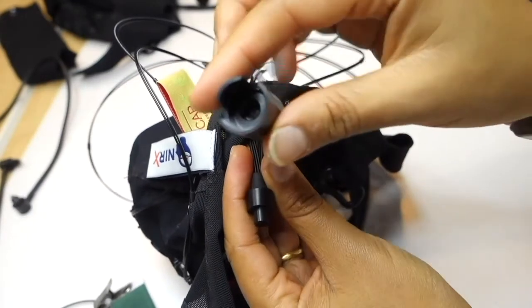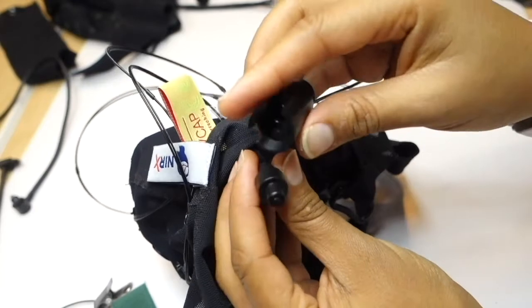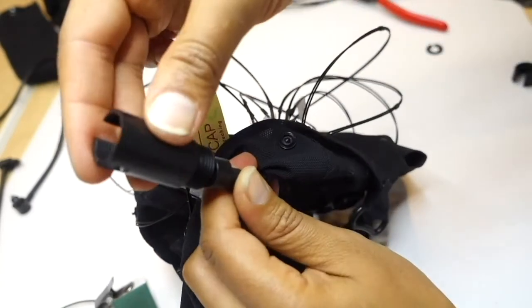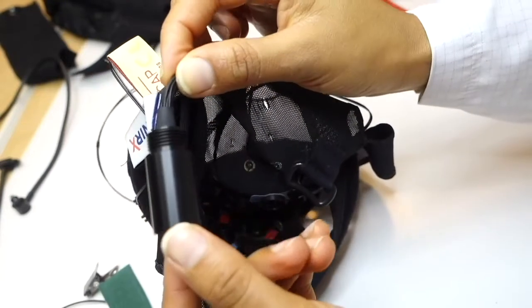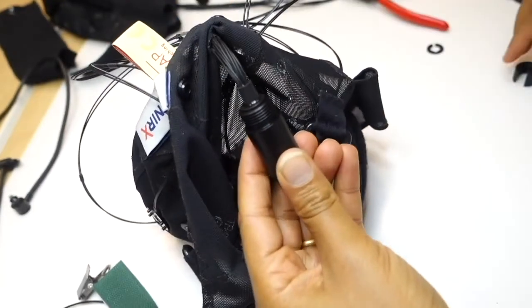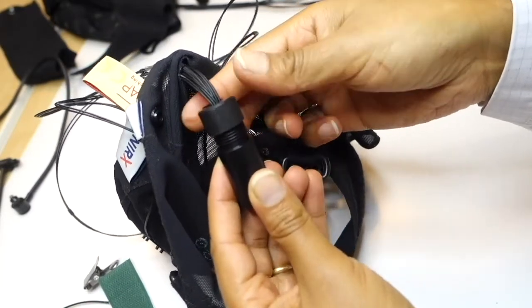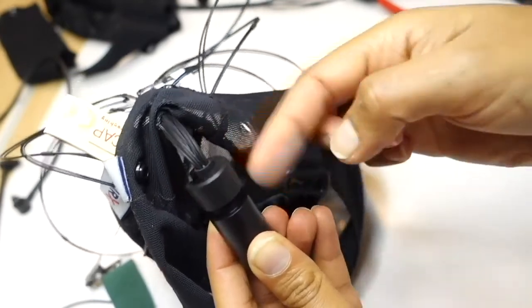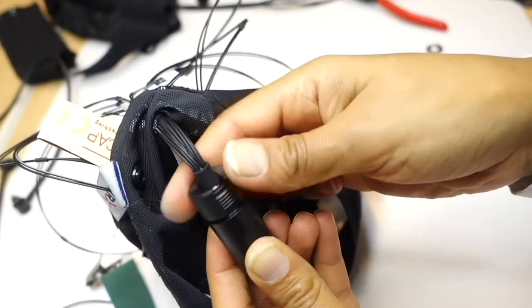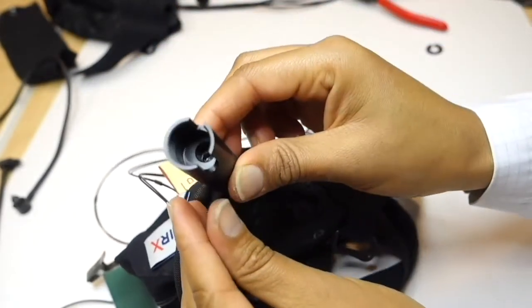To connect the short channel probes, insert the common end of the bundle into the end of the adapter with an outer thread. You can see the thread here. Just place the tapped cap and carefully screw it into its place. Excessive force is not required here. And that's it. You have now connected your bundle with a coupling adapter.